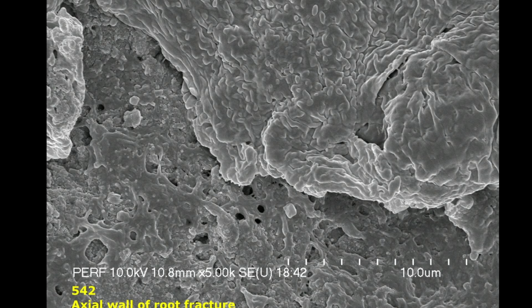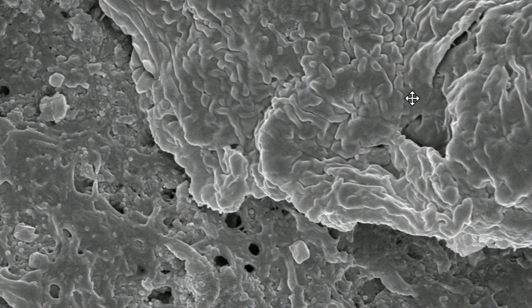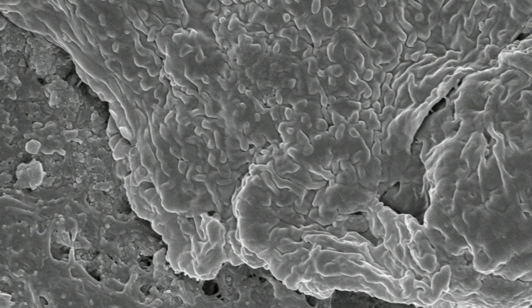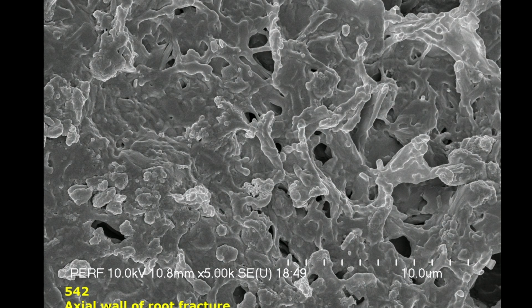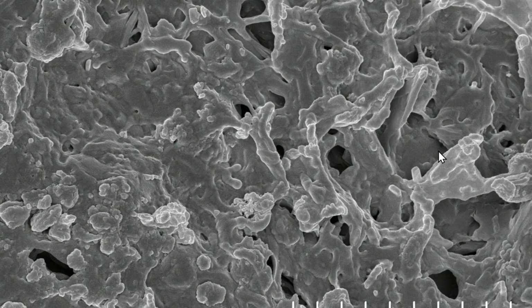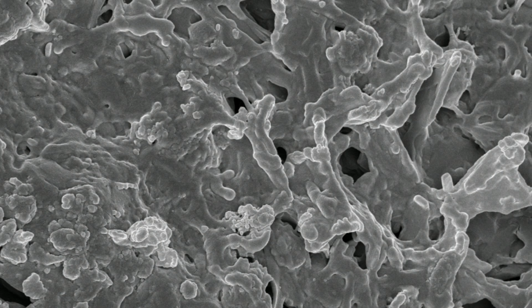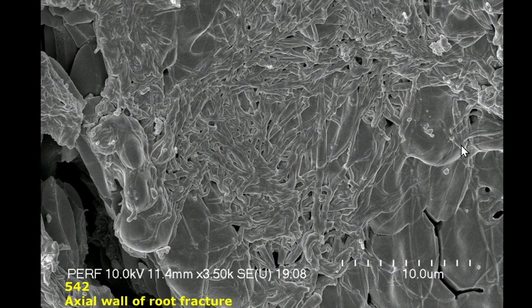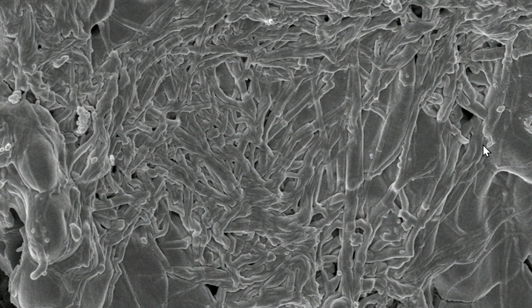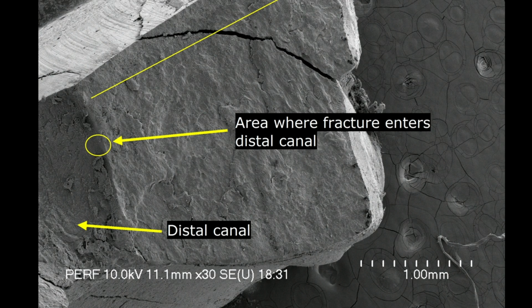So when we go into the other parts of the root in JT's case, this kind of perspective will be helpful for you in recognizing what you're actually looking at. And when you look at these, you gain a sense that there's some organisms here, but there's so much EPS that it's difficult to actually detect individual organisms, which are really the sign of a bacterial biofilm.